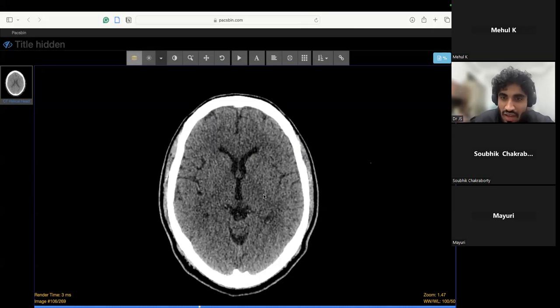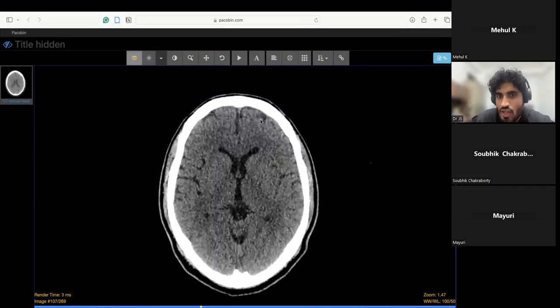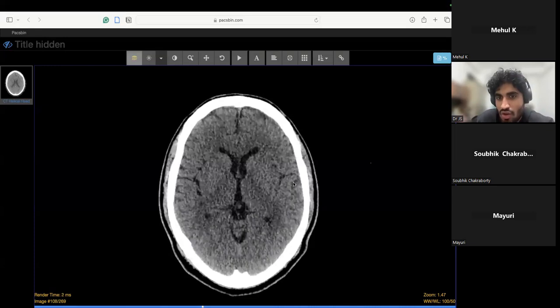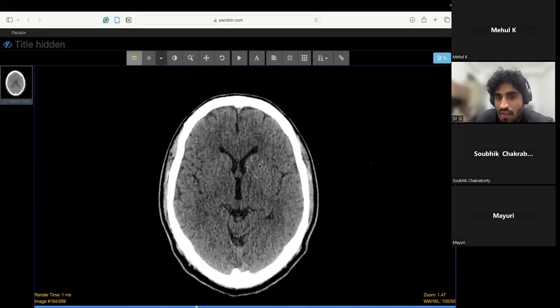A little bit, okay. So here we have the internal capsule. And we have something over here: the lentiform nucleus, globus pallidus, and other things. So this is the basal ganglia. We have a cortex, and we have a subcortex. That is the subcortical region where we have nuclei. So gray matter is mainly the nuclei, the cell bodies with the heads of the axons. So the nuclei part. Similarly, we have the basal nuclei, or what we call the basal ganglia.